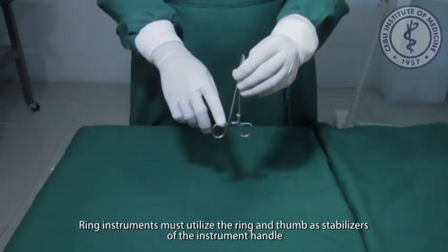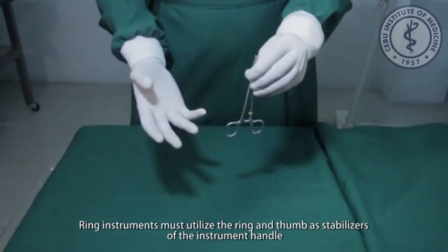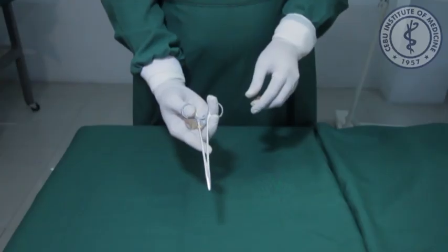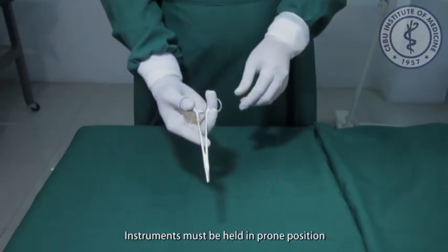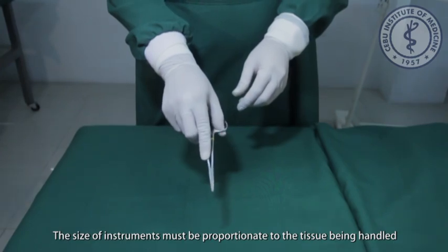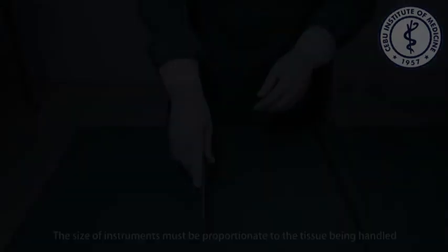Handling of surgical instruments. General guidelines. Ring instruments must utilize the ring finger and thumb as stabilizers of the instrument handle. Instruments must be held in prone position. The size of instruments must be proportionate to the tissue being handled.